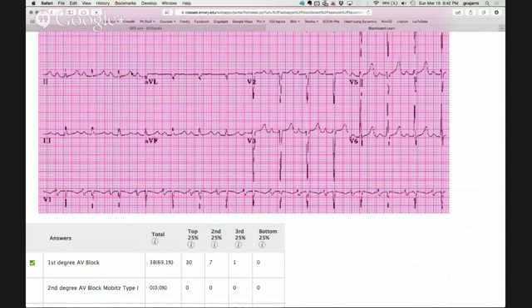So if the interval between here and here is about 5 millimeters, or really probably about 4.5 millimeters, the other wave would be about 4.5 millimeters here. Because atrial flutter waves are going to be regular. Remember that circular circuit that develops within the right atrium that creates that constant beat after beat after beat.